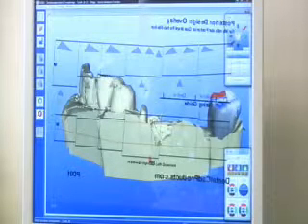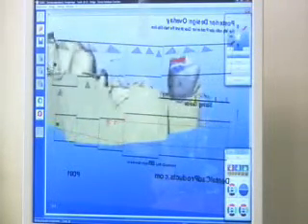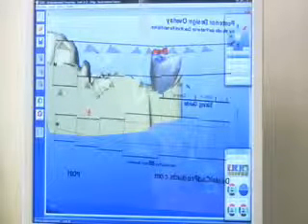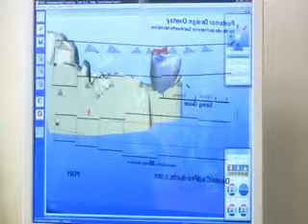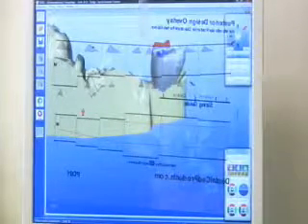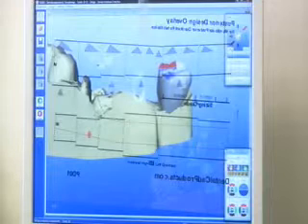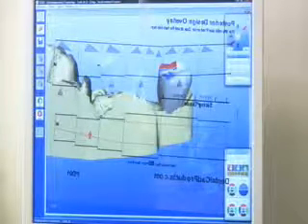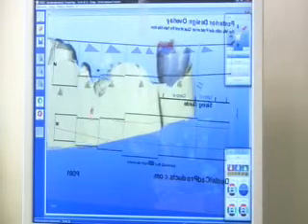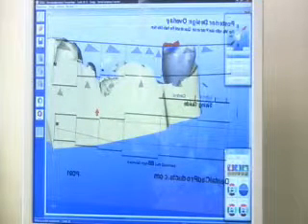The vertical lines have been set up to give me the mesial and distal surfaces of the proposed teeth, all the teeth in a quadrant. We first find some reference marks. In this case, we have the cuspid. So we're going to line everything up by lining up the mesial and distal surfaces of the cuspid, and that should give us proportions that we can carry through.